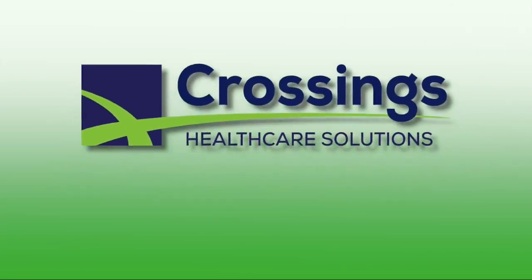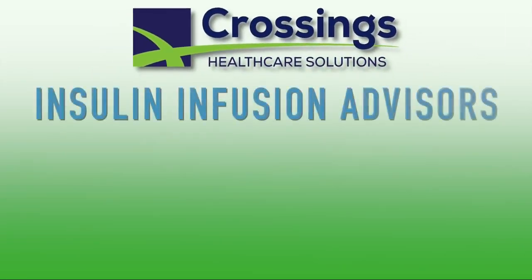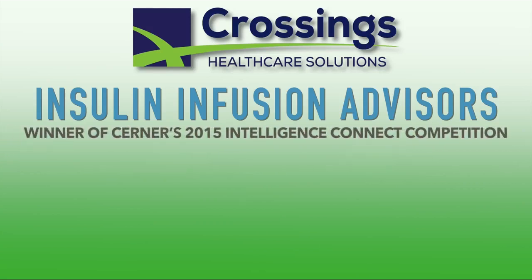Hello, this video will review our custom insulin infusion advisors. We created these advisors in order to help improve inpatient insulin management for hyperglycemic states. Our team is pleased to report that these innovations were recognized with Cerner's 2015 Intelligence Connect Award.